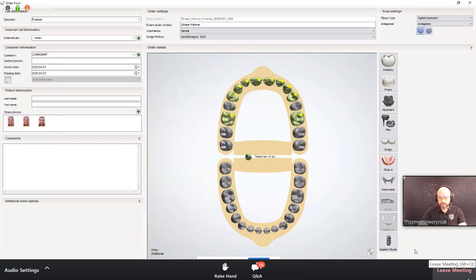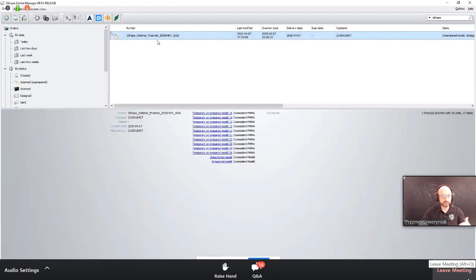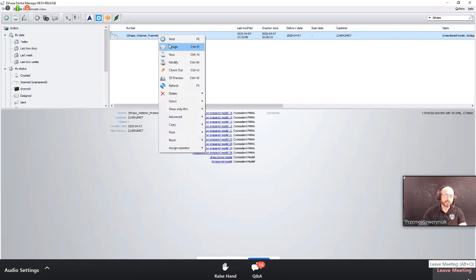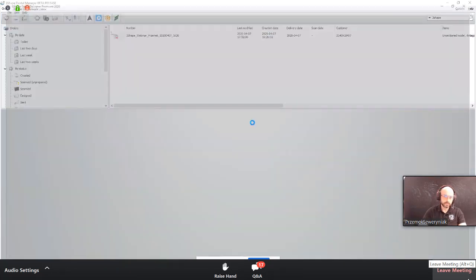And when all the pictures are loaded, then you can press OK. You can also load these pictures in the software, how I normally prefer to do it in here. Because normally when a doctor sends a case, there are preview pictures inside the case already. And those pictures actually prohibit you from importing more pictures inside the case.